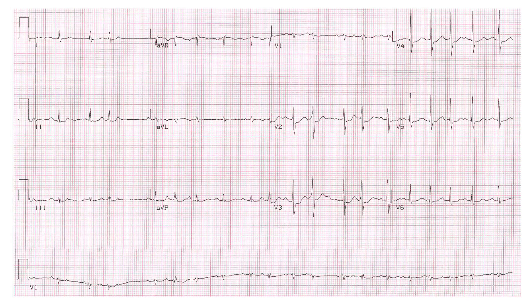But if I were to look in the other precordial leads, it's quite a bit easier to see the QRS complexes. And in lead 2, it's fairly easy to identify the QRS complexes as well. So my rhythm does look irregularly irregular. And then if I take a look at the QRS complexes, they appear to be normal. They're not prolonged. And so I know I've most likely got an atrial rhythm of some type happening, but I don't know what that atrial activity is yet.